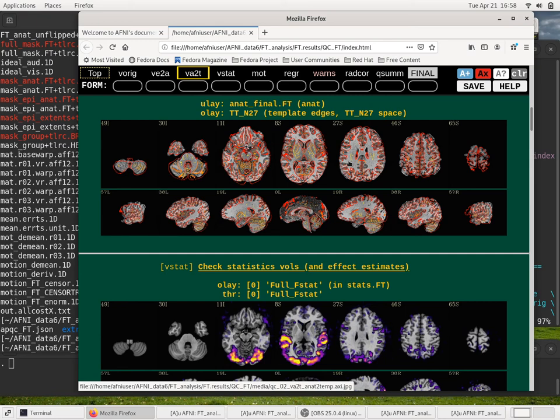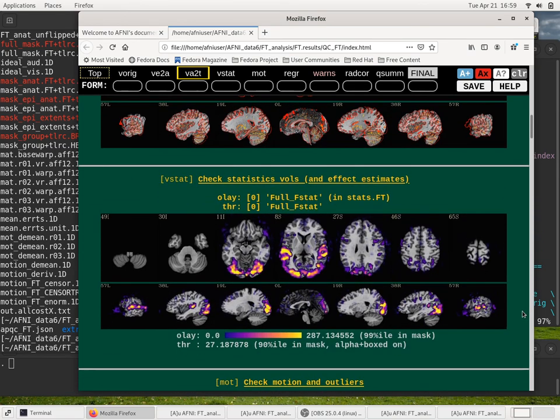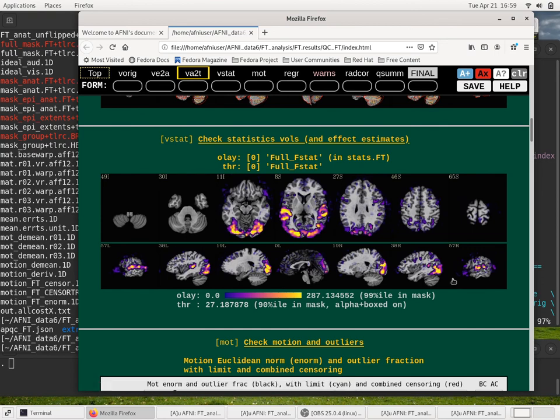And that means your single subject blobs, assuming they are anatomically specific, should overlap well. So you should get better group results using nonlinear registration. But the single subject results should look about the same, just slightly spatially distorted versions of each other.